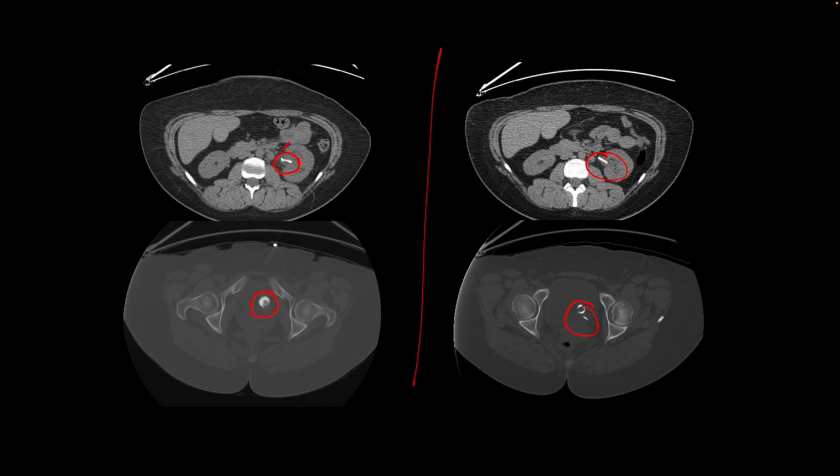So make sure when there is something hyperdense that you're evaluating on CT, you use the right window, and a lot of times bone window is a good place to start, and then you can maneuver to the settings that best show the finding.